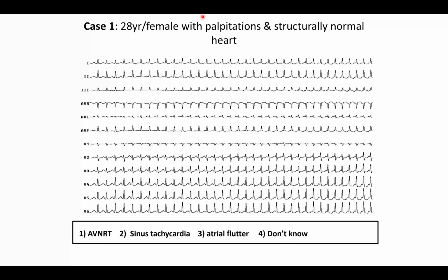Usually there is something called the rule of Fs: age more than 40, or female, and frog sign if you have. Chances are that a narrow QRS regular tachycardia is more like AVNRT. As Daljit explained so well, in AVNRT the P and QRS are lined up, nearly simultaneous. It's a simultaneous VA activation because the tachycardia is going on in the junction, and the atria and ventricles are like bystanders, getting activated nearly simultaneously. So there is a frog sign or cannon waves which occur almost regularly.